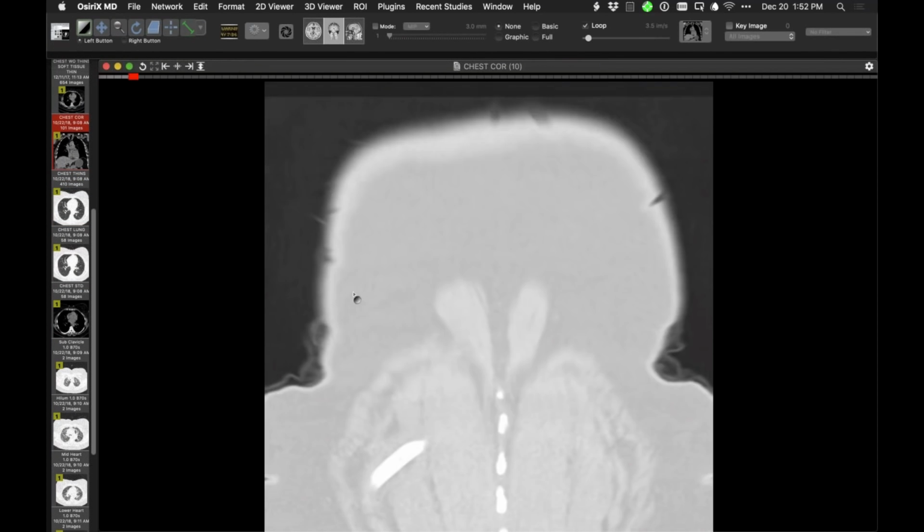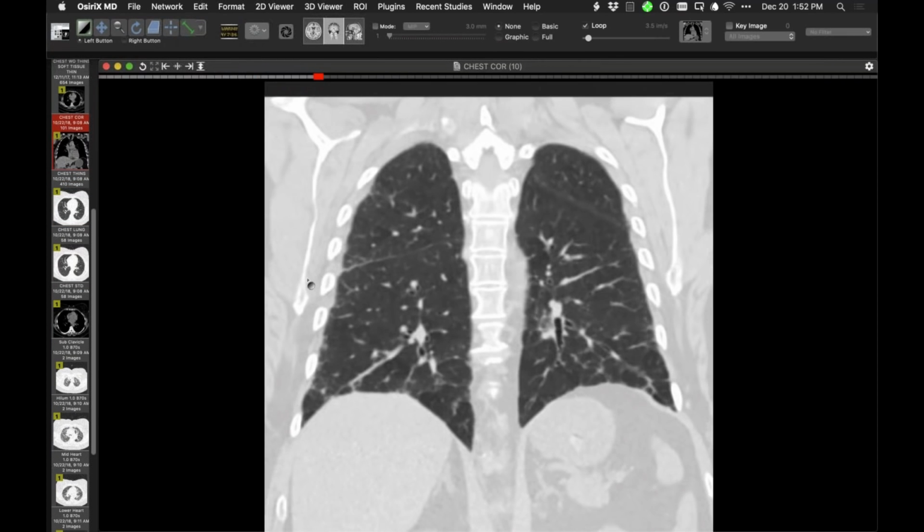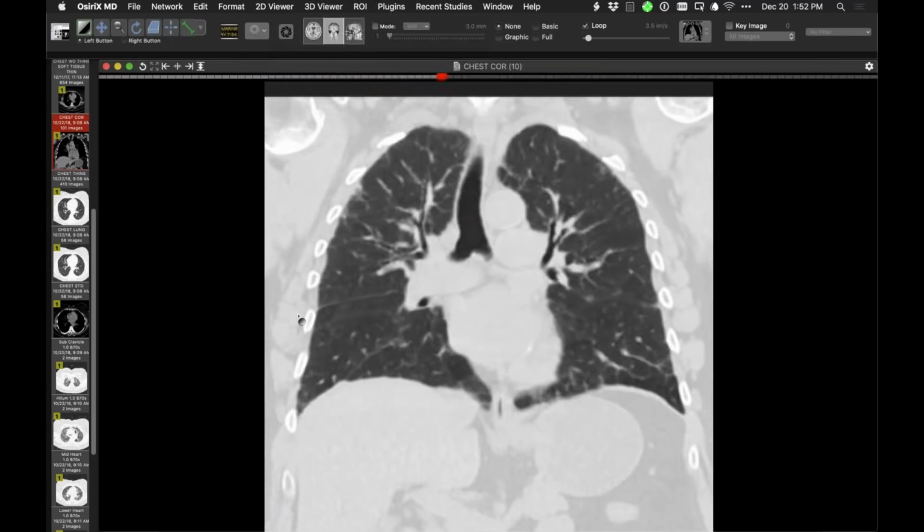Very nice. Can I make a point about a case that I showed last week? I showed a case of a localized dilation of the coronary sinus, and we were calling it a coronary sinus aneurysm. The person had pulmonary hypertension, and since I showed it last week, the biopsy has come back.